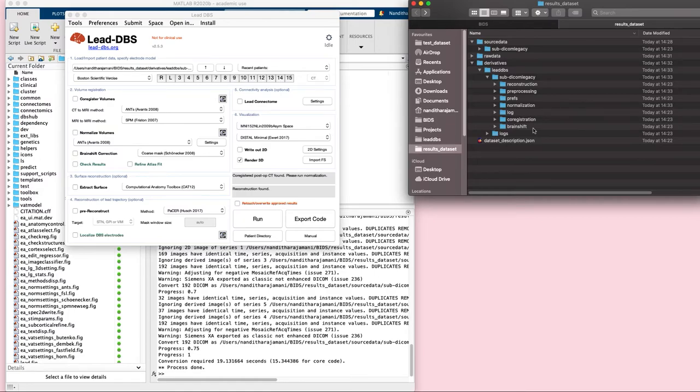So this should give a good overview on the data structure and also file name. This was a quick overview, so a more detailed description would be included in a manual, so you can always look at that for specific details.